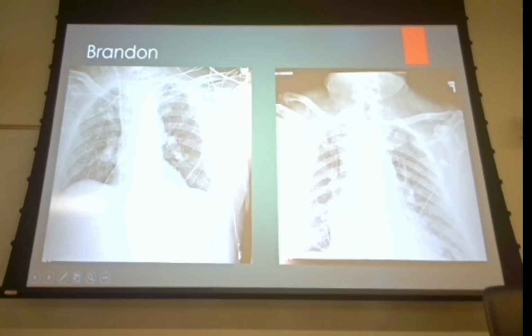So all of those things individually are okay on a chest x-ray to diagnose each one of those things. But if it's for something else, do we need a better inspiration? And the answer is yeah. All right, so again, what is it we're doing the exam for? Find that out, and that may drive whether or not you go back and reshoot this.